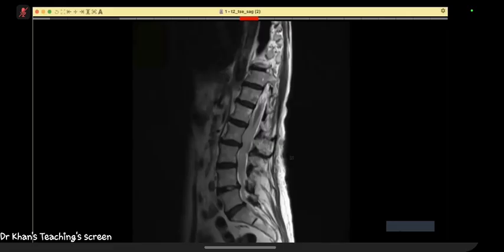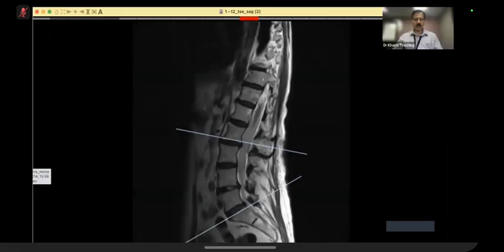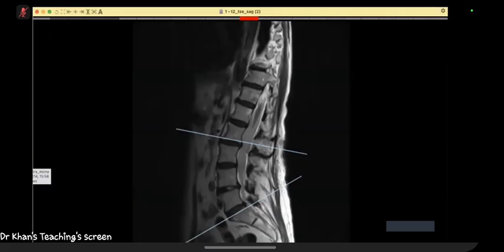Okay. I'm suspecting that these soft tissue sheets are CSF seeding or meningeal metastasis, and I want to see the rest of the neural axis, the brain, to check if there is a primary. First of all, tell me what this is. How will you confirm what your concern is? I would like to see the post contrast images, to see if this soft tissue sheet enhances. I've given you a T2 weighted sequence.